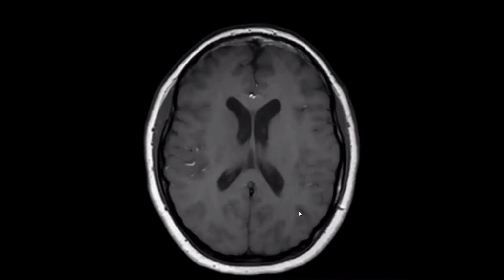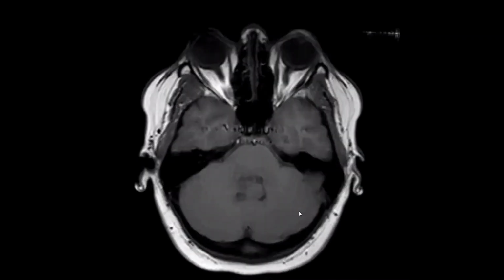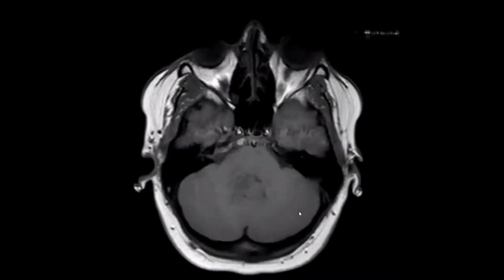Candidate number 14. We have a young adult patient, 30 years old.